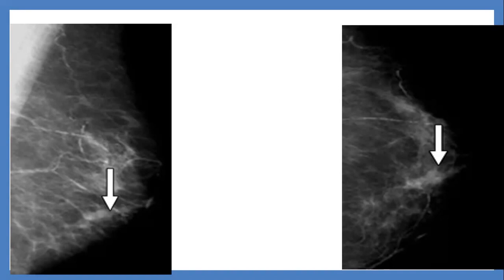Is it tubular, or is this part of the dense parenchyma? It could be part of the parenchyma. There is a difference between it could be and you can see another duct.